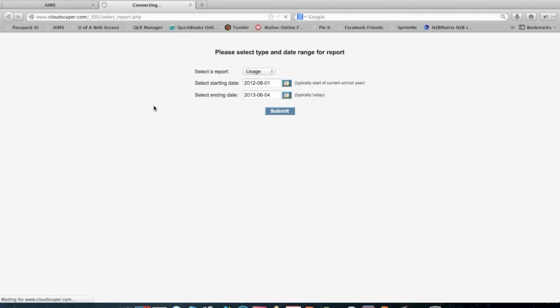Now, if someone goes to this website without going in through our portal, they do not have access to this. There's no way for them to get into this website without going through the portal that I mentioned earlier. But essentially, all of these reports are available 24/7.